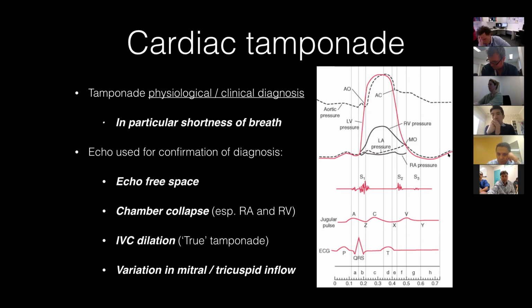Yeah, that's about right. Tell me more about the blood. You said the blood could be echo dense. A bit more about that. So in organized blood, where the blood has clotted and has been there for a while, it can look very much like tissue density, and so it can be very difficult to appreciate that there's a clot there.